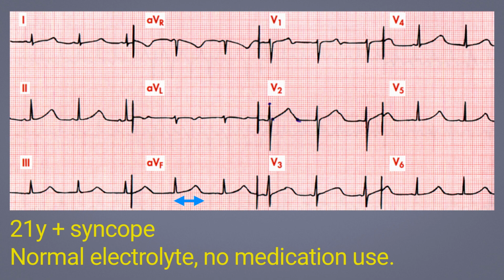A quick tip when you're examining an ECG to determine whether the QT interval is prolonged or not, particularly for heart rates around 60 beats per minute, is to look at the distance between two QRS complexes. Divide this interval in half. If the T wave extends beyond the midpoint between these two QRS complexes, it's highly suggestive that the QT interval is prolonged. Of course, we can only confirm this through actual calculation.